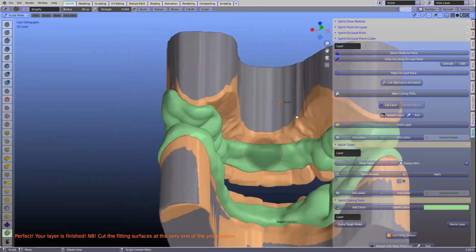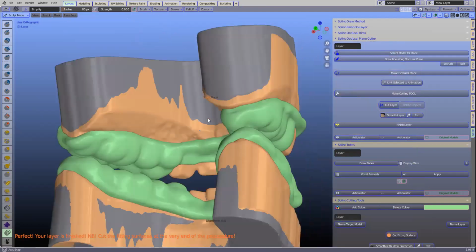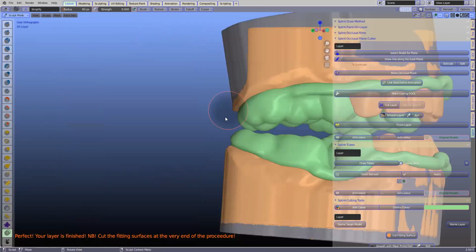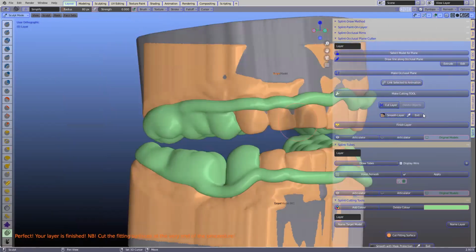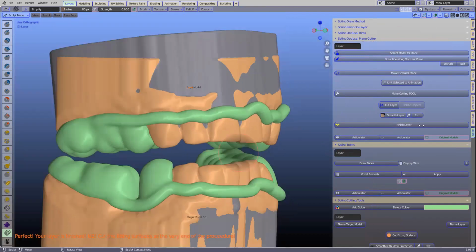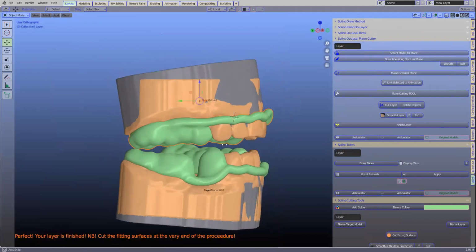So you're melting it. Like you're melting it down to make it polishing. Keep in mind that the splint is still penetrating into the model. So whatever you do, it doesn't matter. We're just working on the outside surface. Yeah, it doesn't matter.